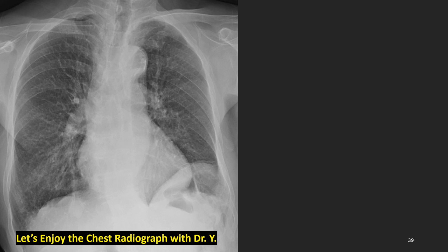Let's go down. What do we see? You got them? 1.5 centimeter nodule, you see? Is that in the liver or in the right lower lobe lung? Yes, in the lung. Although this nodule has ambushed below the diaphragm, we got him. We found him.